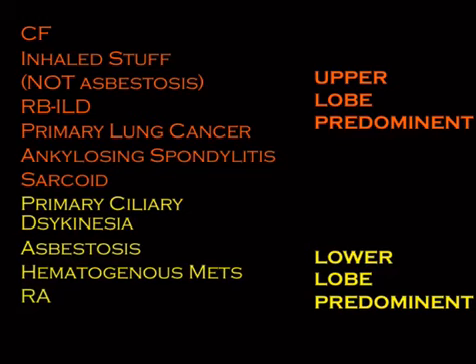And then RA, I remember that because it's the opposite of ankylosing spondylitis, so A comes before R in the alphabet, so A's on top, R's on the bottom. And then UIP, I mentioned that before, has a known described basilar predominance.